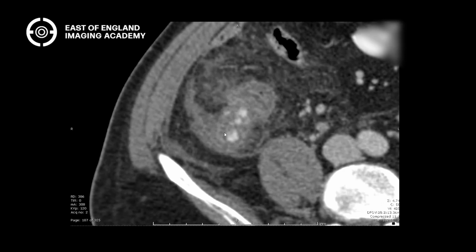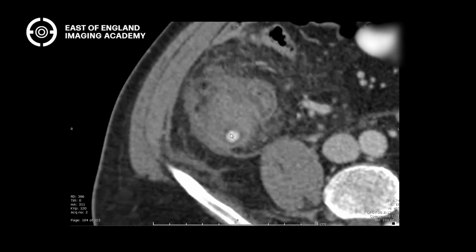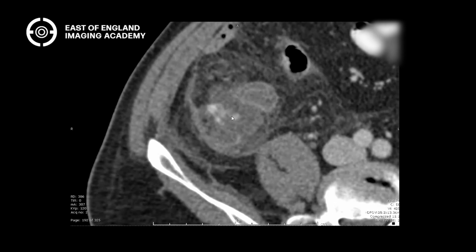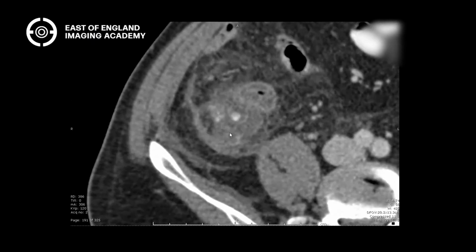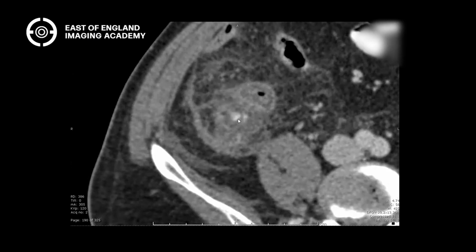But then, okay, so we've identified cecum, terminal ileum, appendix, and we can see the appendicular there. That's all fine, but what are these things? Because these are not in the line of the appendix. So what do you think these things are? Because the appendix is down here, isn't it? Yeah, you can follow it. So where are these? Are they in bowel?